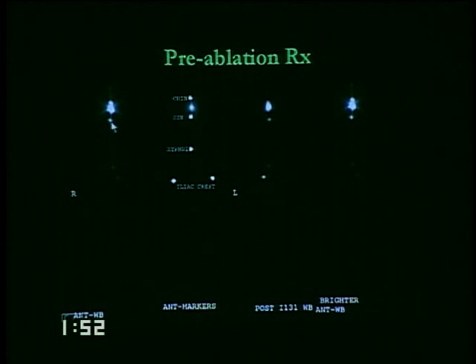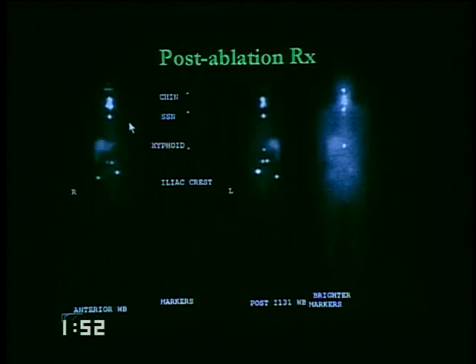Pre-ablation therapy, we do see METs. Post-ablation therapy, a little bit of activity, retroperitoneal lymph nodes.